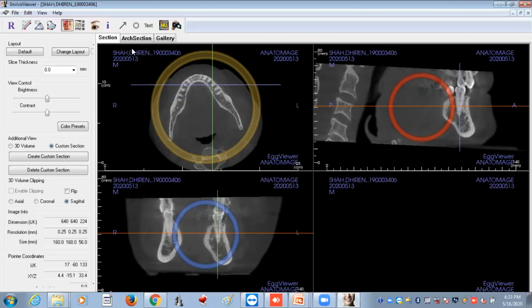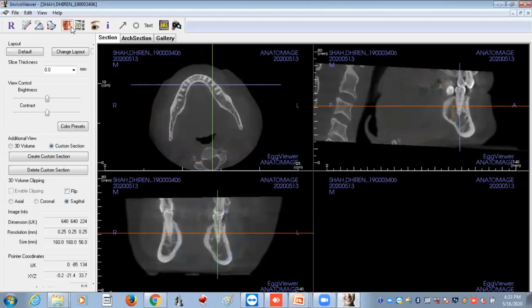Now, if this kind of image comes to me, that might be confusing for me, as I may not be familiar with this kind of image, because as dentists we are all familiar with images like OPG or IOPA. So my suggestion is that it is better that we first see the pano image and then do the eventual sectioning.